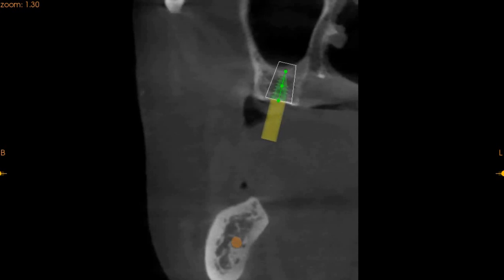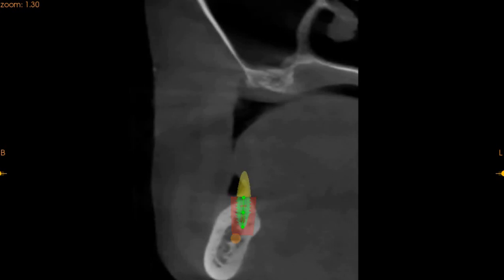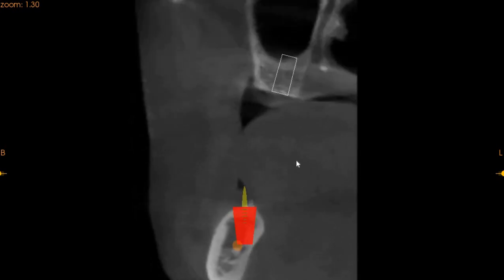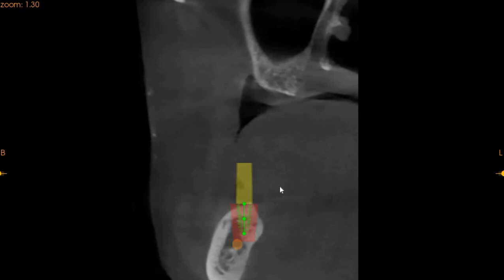Moving to the lower left region, we have insufficient bone, so the implant placement is going to be very difficult. We will need a shorter implant, with the brand that we were advised, Neobiotech. And again, the shortest implant size that we have available is 7.5. If we have a shorter implant of approximately 6.5 in length, then an implant can be placed distal to the mental foramen.